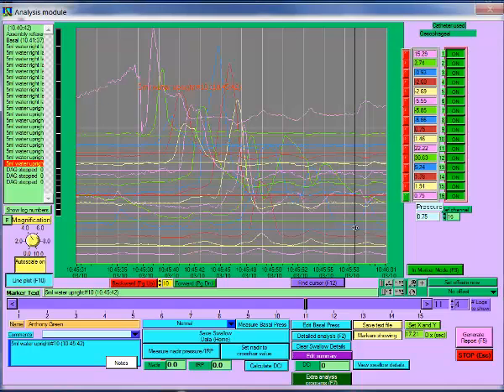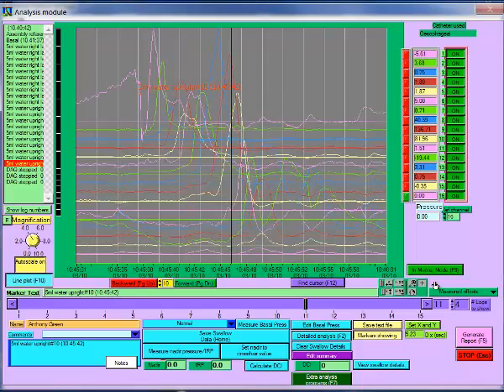When the cursor is positioned at the point where the catheter is perfusing underwater, click on Set Offsets Now, and the values recorded at that time will become the new 0 points for each channel. The offset control changes to indicate that you are removing measured offsets.